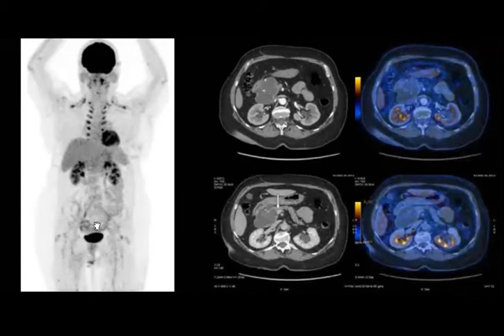10 stars for you, Sarah. Thank you. So what is it called? Brown fat. Brown fat. Perfect, Sarah.